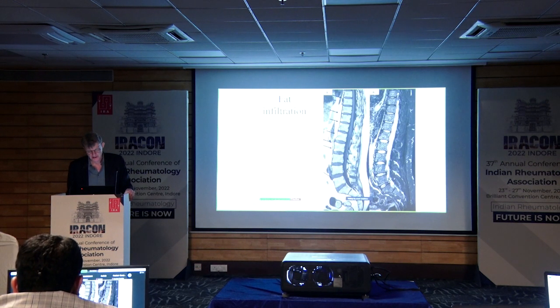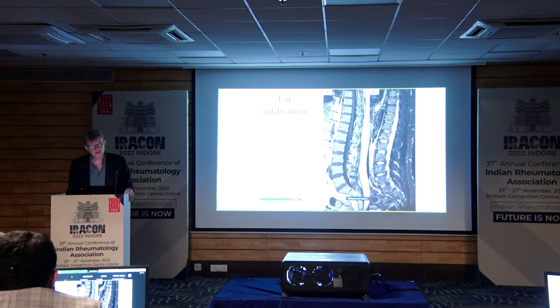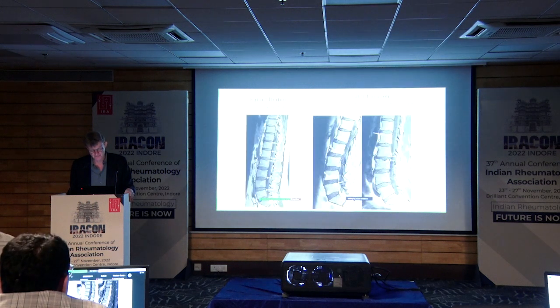Another example here of fat infiltrations. It should be mentioned that because you have a few of those, you have not diagnosed actual SPA. It can happen also in degenerative disease, it can happen in different conditions. So unless you have really many, and the exact border is questioned, but perhaps 6, 7 of them, then you may be quite certain it's actually SPA unless there's a specific reason for it that is known. But a few of them you can see without having actual SPA.